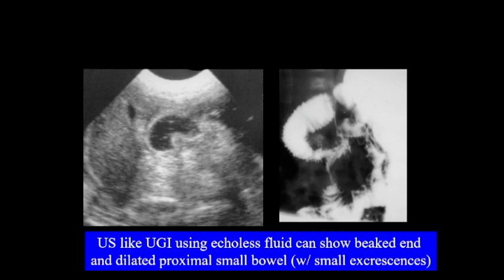This is another case of ultrasound showing a twist in bowel, somewhat dilated, descending duodenum. You don't see what we have sometimes seen, these irregularities along the edge, similar to what you see in a GI contrast study in which there'll be filling in of what are glandular elements, some people say, proximal to an obstruction.